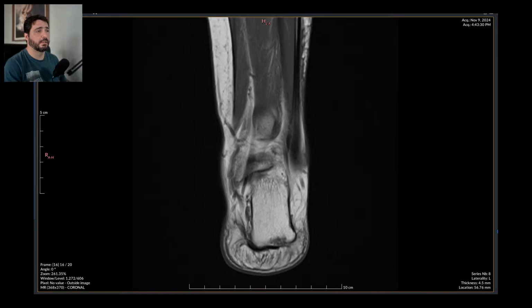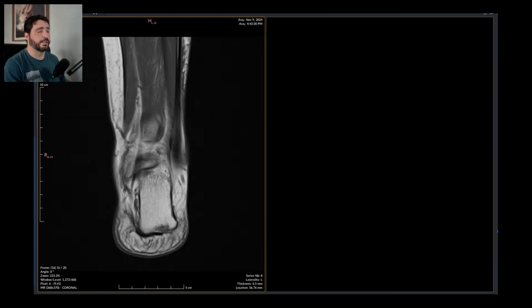Ankle template, just copy and paste. There it is. Oh, at least it downloaded. Yep. It's a female patient.